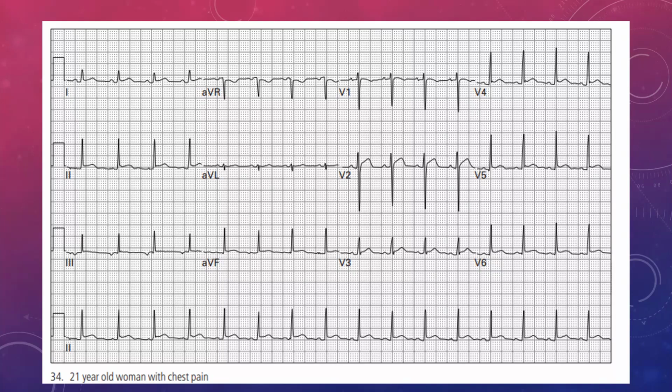Now, the reason why I wanted to discuss this ECG is because I've seen a lot of our younger doctors and even a lot of the general practitioners in town who I deal with, they tend to struggle with these when they do find them, because it is worrying when you see a whole lot of ST elevations. Am I missing an infarct? And especially in a young patient, am I missing an infarct in a young patient?